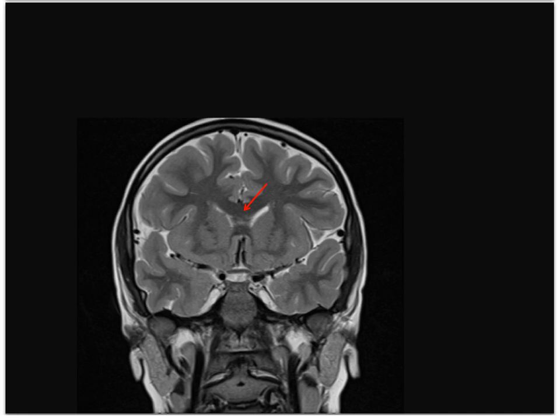Here is the anterior body of corpus callosum and anterior cerebral arteries in the lower portion of the longitudinal fissure. This structure is the optic chiasm, and it's within the suprasellar cistern. These are middle cerebral artery branches in the lateral sulcus.